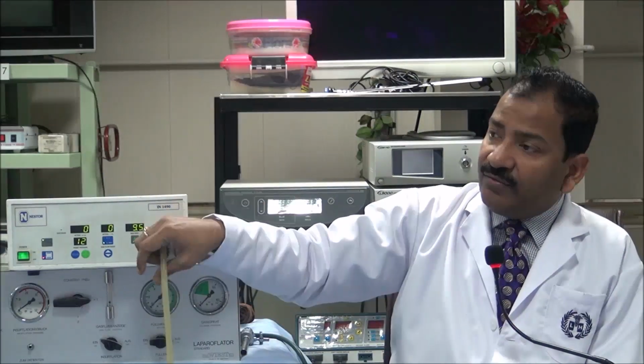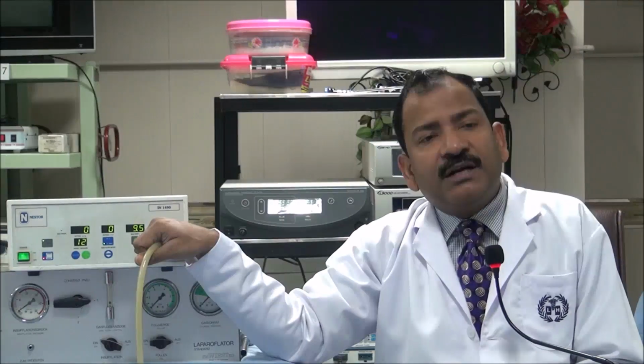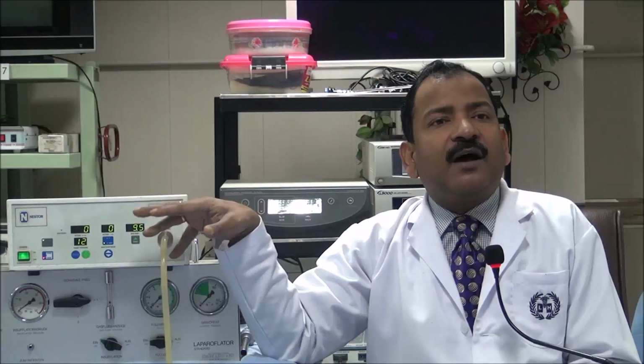Even 2 ml of blood or fluid from the abdominal cavity, if it enters the insufflator, there is a sensor and a diaphragm, and immediately it gets spoiled. So this is a small precaution that has to be taken. That's why in many insufflators it is good practice to attach a filter here. There is one filter at this point in the insufflator, and it is good to attach it. That will not allow fluid from outside to enter, and it filters dust particles and other common contaminants. Remember, from the CO2 cylinder, bacteria can never come.